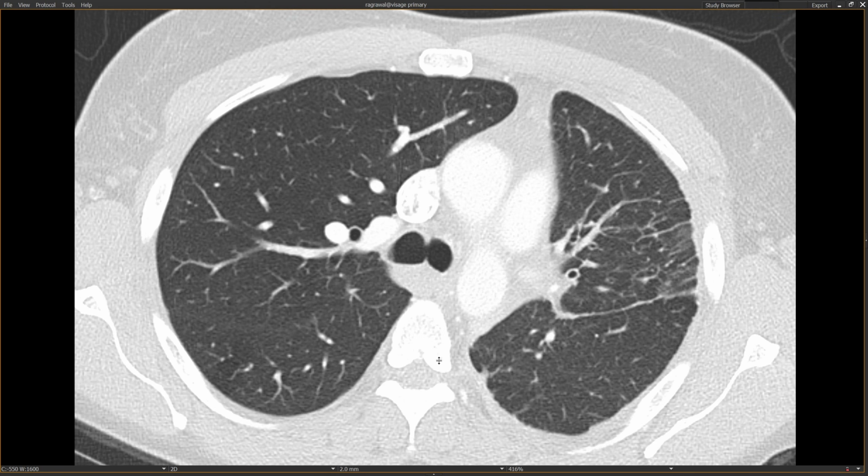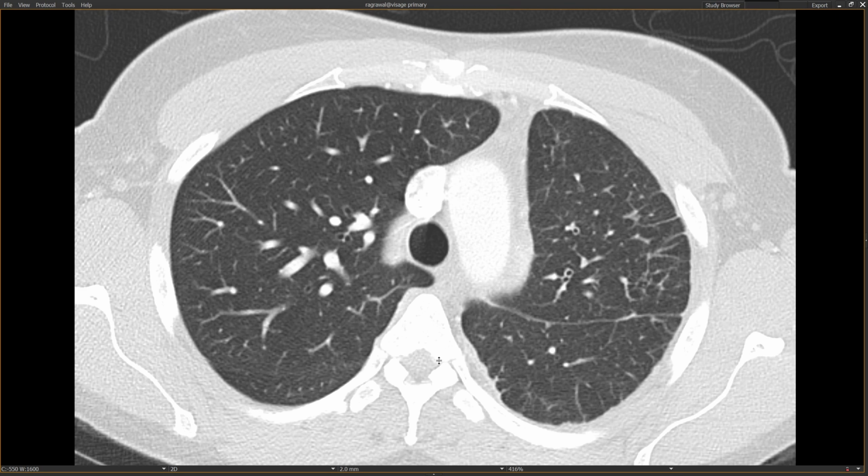The second thing is that there's multiple lines in the left lung. And if we look closely, those lines represent interlobular septations. So we have interlobular septal thickening here. Most of the time when you see interlobular septal thickening, you're dealing with pulmonary edema. But why is the pulmonary edema in this case so unilateral, where it only affects the left lung and not the right lung? So I can think of a few different causes, and this is not a comprehensive list, but it covers many common causes of unilateral pulmonary edema.